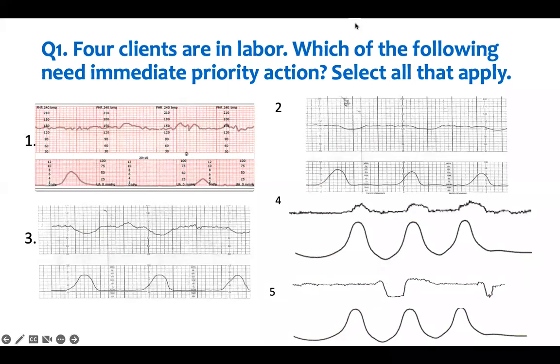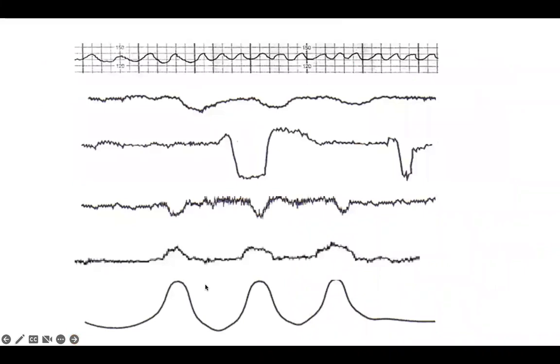And then before we finish, I just want to show you, these are all the tracings. I tried to put them together and make it easy so that you can see them. You can see how you have one slide with all of them. So this is the mother's contraction. There are 3 contractions, okay? 3 contractions, this is good, less than 5. But just by looking at this, I'm good. And this is almost more than 2 minutes.